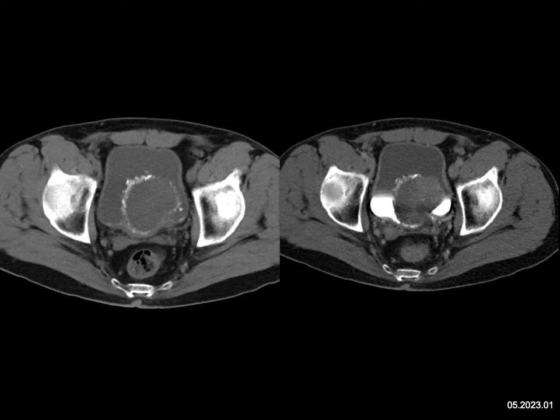Now, what gives you bladder masses? This one's a little bit unusual, that's relatively lower density. Pheochromocytomas can be solid, but they're typically vascular. A calcified hematoma, I guess that's theoretical, but I've never seen a calcified hematoma in the bladder. Hematomas can have rim calcification. Lymphoma can involve the bladder, but usually it's not a mass in the bladder, and I would not expect to see any calcification in lymphoma unless the patient was treated, particularly with radiation.